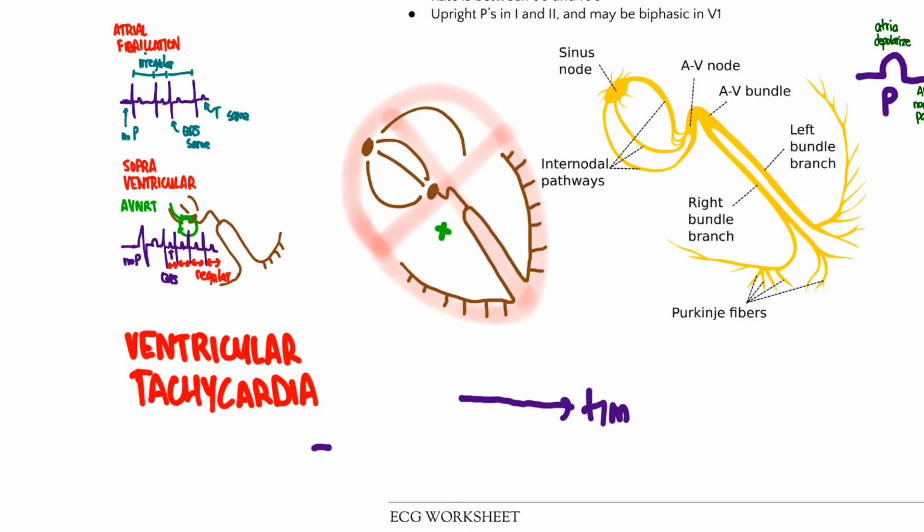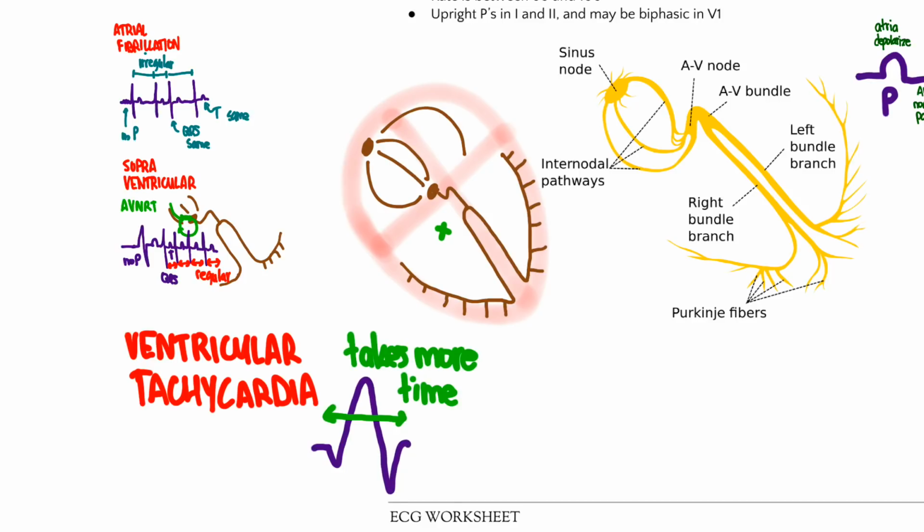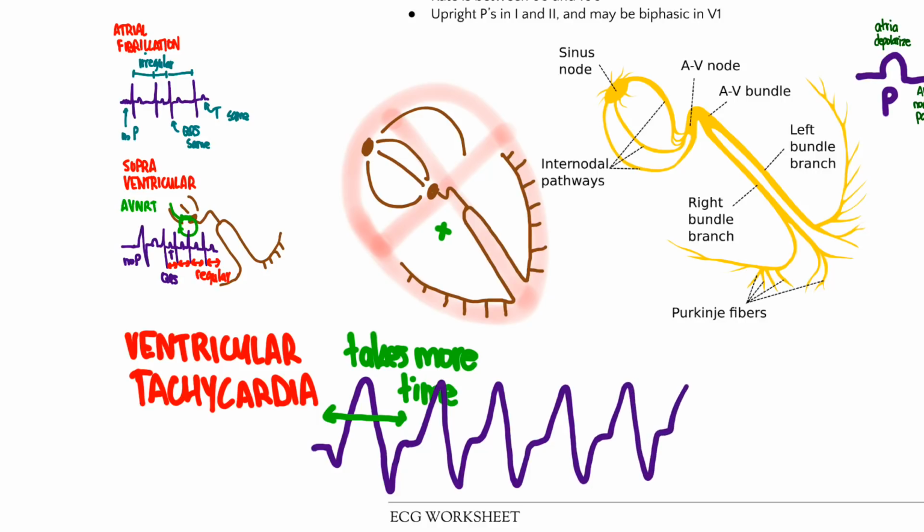So now we are going to look at the same thing here, and we're going to say, all right, fine. This guy that starts here is going to meander slowly through the ventricles. And so you're going to have your QRS type thing, but it's going to be big, right? Because it's going to take a lot of time. And so this particular tachycardia tends to look something like this. And it goes usually pretty fast. You can see how the QRS is wide here. This could be a stable rhythm, but it might not allow enough time for blood to fill into the heart, and so you don't want to stay in that rhythm if you can avoid it. And there are ways to treat that. So this we looked at is a ventricular rhythm, and the main point is that the QRS was wide because we were not following these superconducting His-Purkinje fibers that allow us to get through the ventricles quickly.